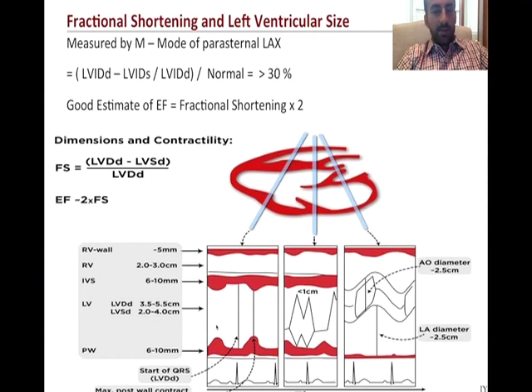Here again, this diagram shows the utility of potentially using M mode to get more precise measurements, and how you would assess that via the following pattern change and calculation.